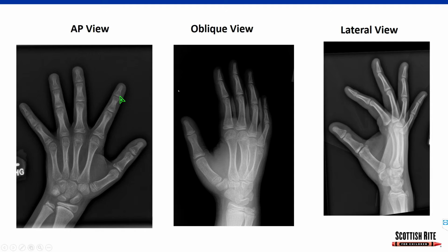It's a common place. Really anywhere in our body that has a growth plate, that's an anatomic weak point. And for young children, oftentimes they will end up with a fracture through that growth plate, as opposed to something else we'd get in a more skeletally mature patient. So again, a good AP, a good oblique, and a good lateral. The great thing with the hand is, oftentimes we'll have finger injuries, and I always get the question of, well, do you get hand or finger images?